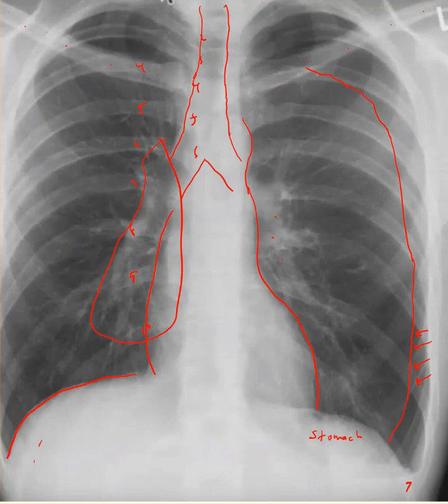And of course, treatment for this guy, apparently a spontaneous pneumo of less than 20%, you can usually treat conservatively and keep them in the ER or admit them for observation for 6 hours or so. Put them on oxygen, 100% non-rebreather. And the oxygen really speeds up the resolution of the pneumothorax from many hours to just a few hours. And then you can retake the film in 6 hours or so and check out the improvement and probably send him home.